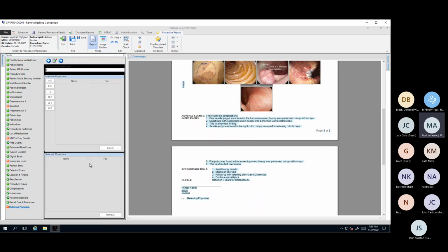And lastly, we have our referring physicians. You can click on these little markers to find your referring physician. So let's say both referring physicians where their last name starts with E to H will show up here. I find this pretty hard to go through, but different doctors find what's easier for them. What I find a bit easier is just typing out the last name. So let's say, for example, all doctors with the name Guy in it.